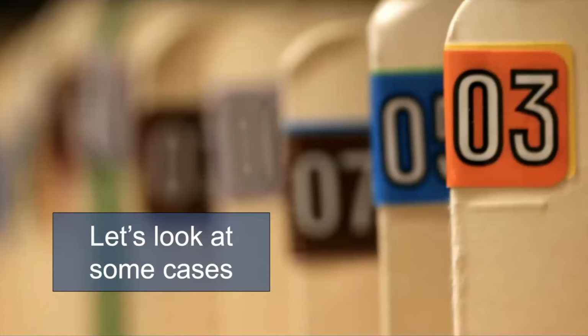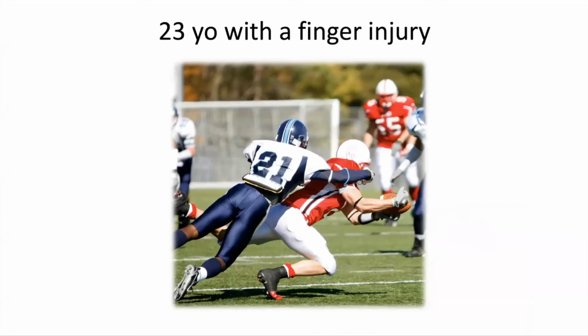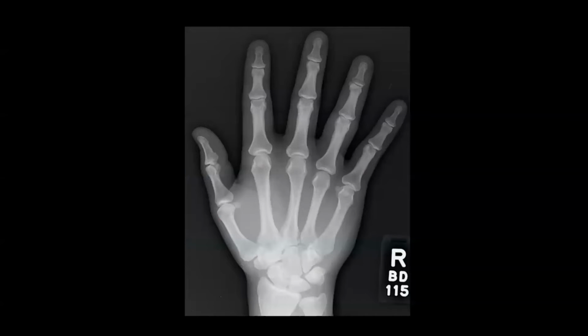We're going to sort of rapid fire go through some of these. As we start, one of the things I want you to keep in mind are the ABCs. They work really well in radiology, and particularly for musculoskeletal radiology. It's A for alignment, B for bones, C for cartilage or joint spaces, and then S for soft tissues and spacing. And you want to run those ABCs through your mind as you're looking at these films. And again, because of time today, we're not going to do this on every film, but as a general rule, as you're looking at these, run your ABCs.